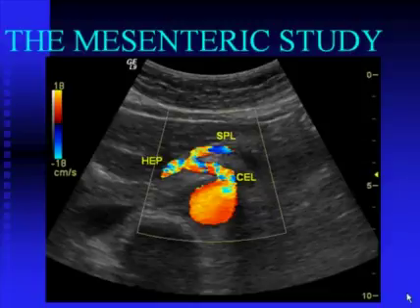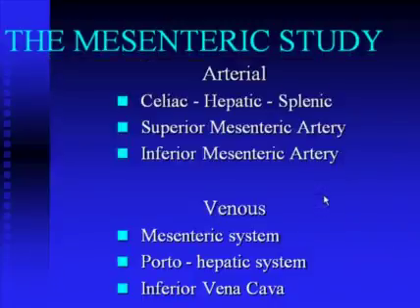Again, one thing I want to point out at the very beginning, since we'll be talking about duplex ultrasound, is I like to differentiate between so-called textbook images, such as the one you see here with a clearly seen celiac trunk, hepatic and splenic artery coming off the proximal abdominal aorta, which you would like to publish in an article or a textbook, and real-world images, which is what we see clinically. Hopefully you will see predominantly real-world clinical images today and not so much textbook, so you don't get discouraged when you try and do this examination.